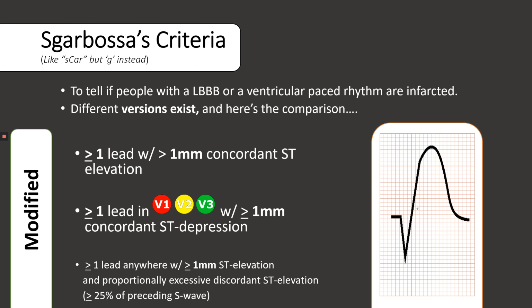So we're going to draw our QRS, okay? Again, draw the isoelectric line. You measure the height, or the depth, if you will, of that QRS. So from the isoelectric line to the very tip, the furthest tip, even if it's a little janky, right? You got maybe a couple things there. Just go to the furthest tip there. Measure that. Measure from the isoelectric line to the J point. So separate number. Okay, so you've got two different numbers now, two different heights. And what you're going to do is compare those two.